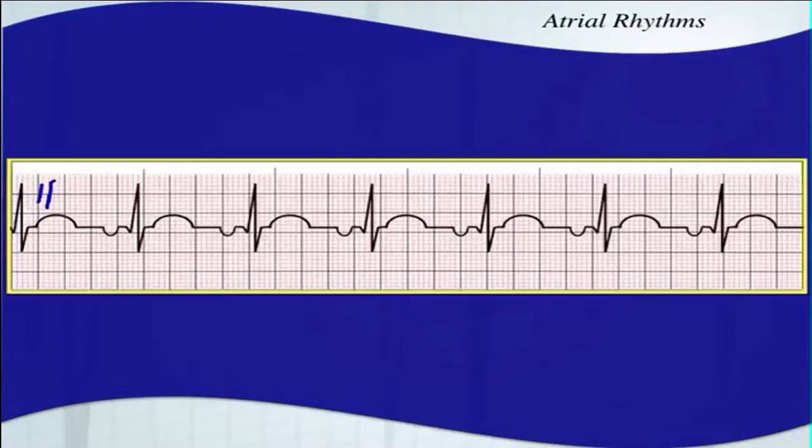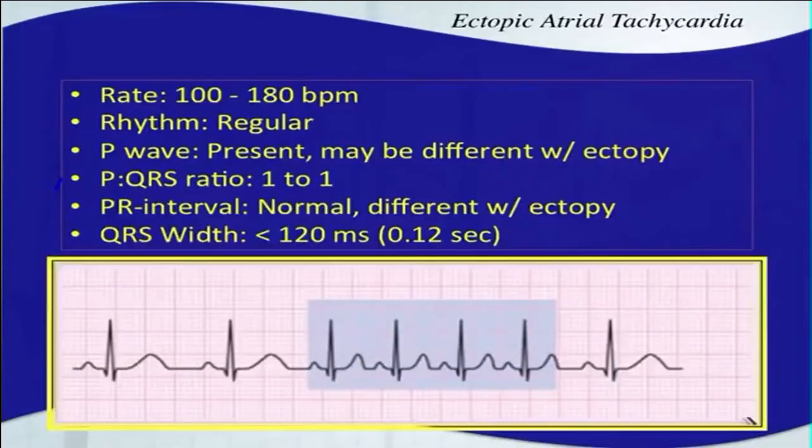If we were looking at lead 2 here, and we saw these negatively deflected P waves, they're inverted, we would say that this is not a sinus rhythm. It's some other ectopic foci. Since there is a P wave, we know it's coming from the atrium, so it is an atrial rhythm. Sometimes we call it an ectopic atrial rhythm. It looks like a sinus rhythm in every way except for a negatively deflected P wave in an inappropriate lead. We'll talk about that a lot more in 12 leads when we're looking at all the leads together.